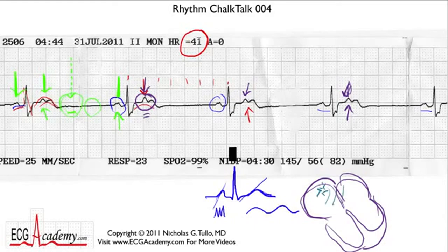have an electrical signal that gives rise to a P wave, and that's what we are seeing as a premature atrial beat. Well, but it didn't conduct. Why didn't it conduct? Well, remember that the AV node takes some time to recover from the previous beat. It has a certain refractory period. So after this beat conducts down the AV node, there's a certain period of time where the AV node is busy conducting that beat to the ventricle, and it takes a split second to recover.